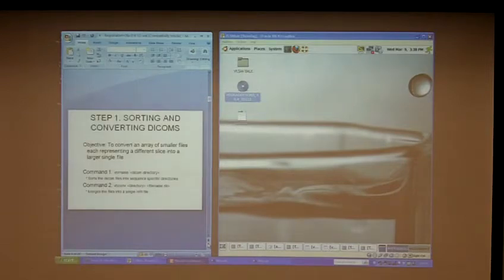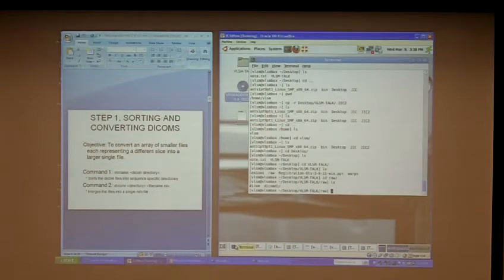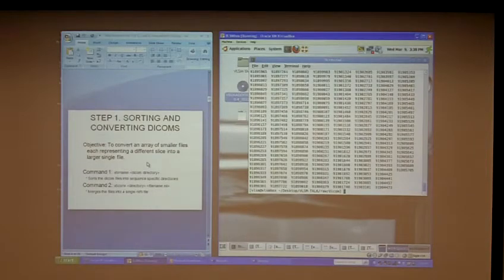Okay, we're assuming that you've gotten your scan, and at some point you have some kind of Dicom files, whether they're clinical files from a clinical scan, or you went to the scanner and you have your research protocol of some sort. Basically, you're going to have a big directory of Dicom files, which, if you've ever looked at them, is a series of numbers. It doesn't make sense. It's really difficult to work with. So Voxbo has a really cool command you can use. It's called vbrename.